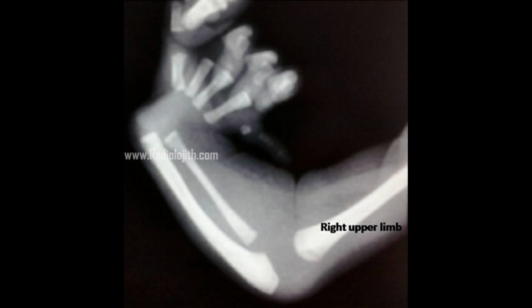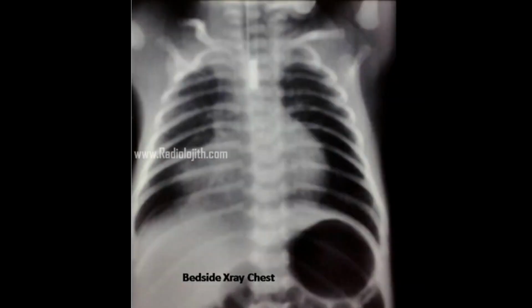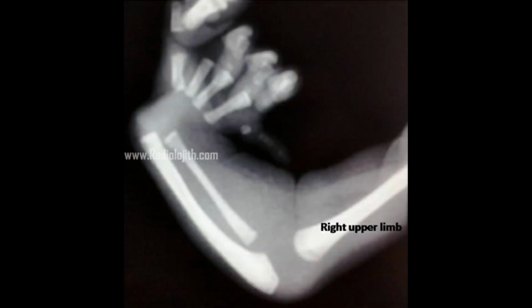Baby weighed 3.1 kg at full term normal delivery. This was not detected antenatally in the village-based hometown. If you want more time, please pause the video and review the images again to assess further.